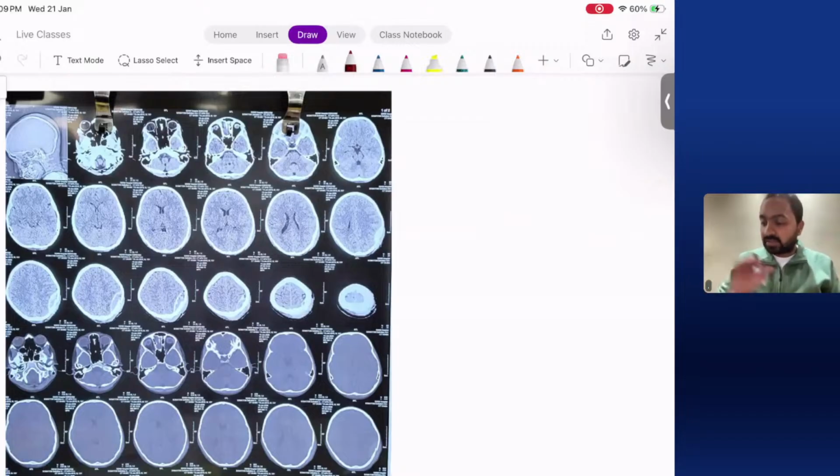So we have this first CT. Students, I would want you all to see this CT and come to a diagnosis of what you can see. You need to find out what the pathology is over here. If you look carefully on the left side, how do you identify which is right or which is left? A very simple trick: look at this, this is your scout image, right? This gives you a hint towards the starting point of your CT scan. This part which I am marking with the blue is your right side, and the one I'm marking over here is the left side.